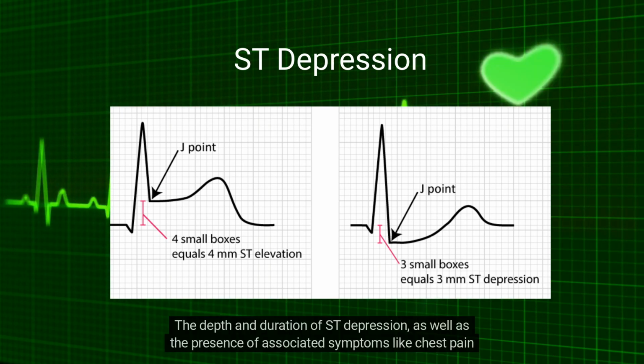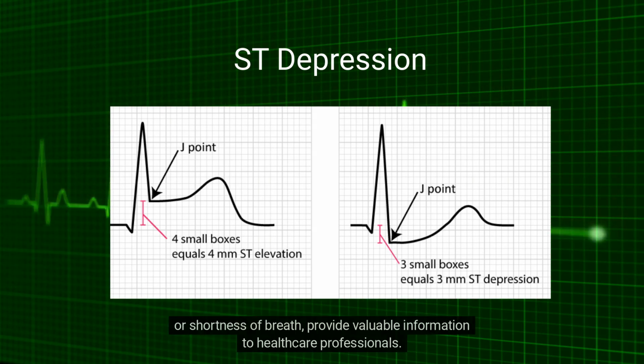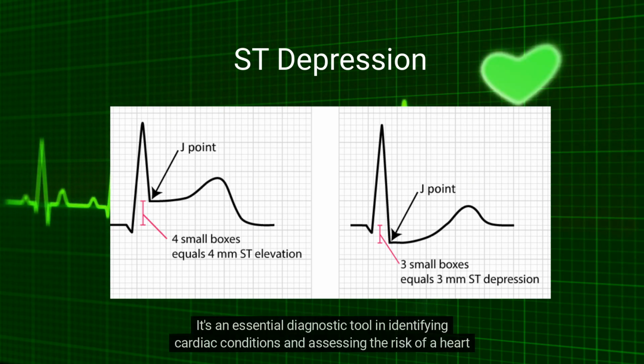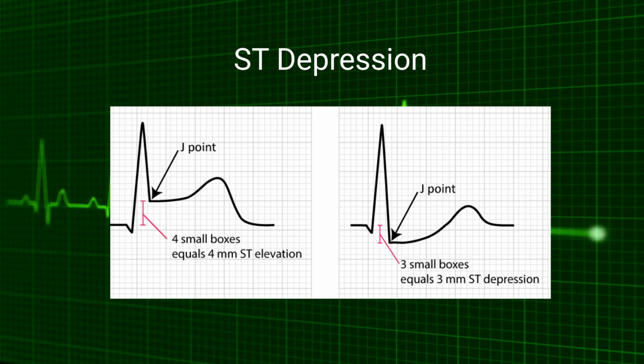The depth and duration of ST depression, as well as the presence of associated symptoms like chest pain or shortness of breath, provide valuable information to healthcare professionals. It's an essential diagnostic tool in identifying cardiac conditions and assessing the risk of a heart attack.